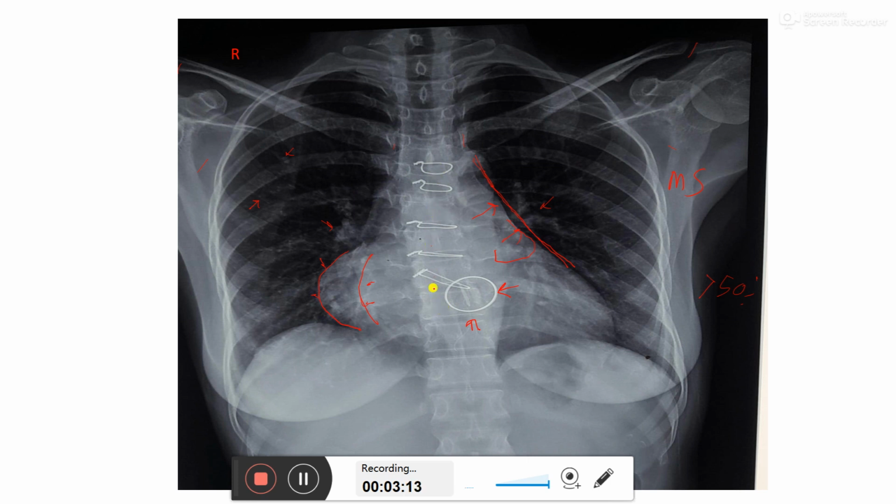These are for the suturing, for a cardiothoracic operation.